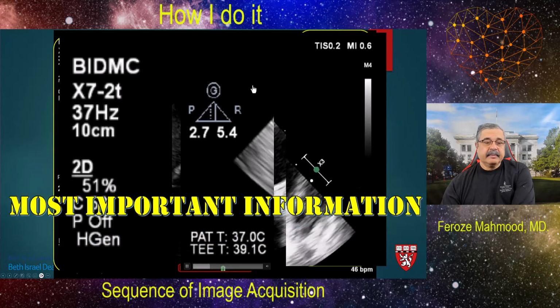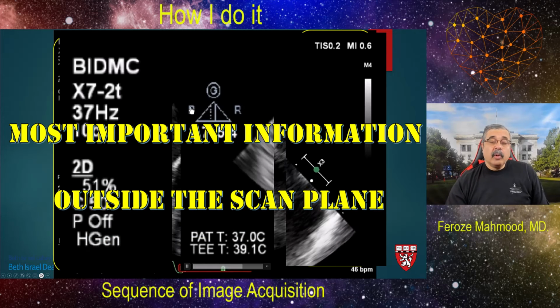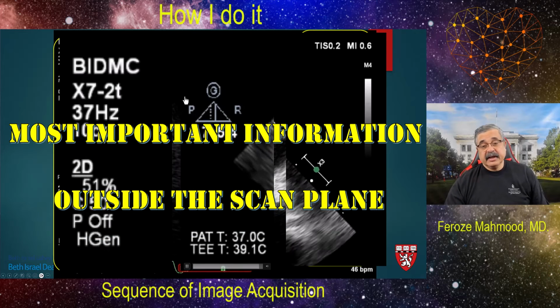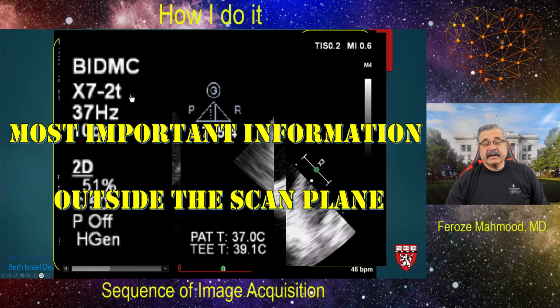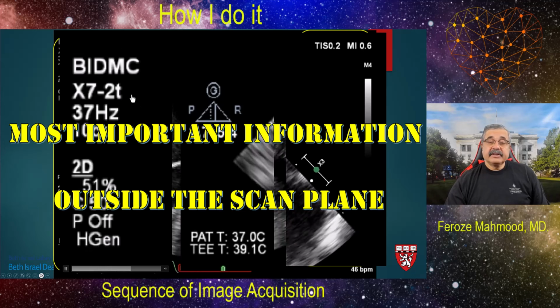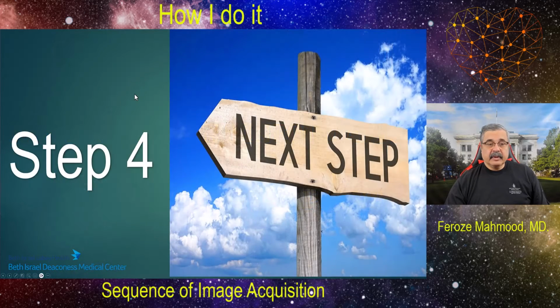And that implies that some of the most important information that determines the quality of the examination is essentially outside the scan plane. So you have to look at it, and sometimes simply looking at the scan plane settings, you can be pretty certain how experienced or novice the operator was.